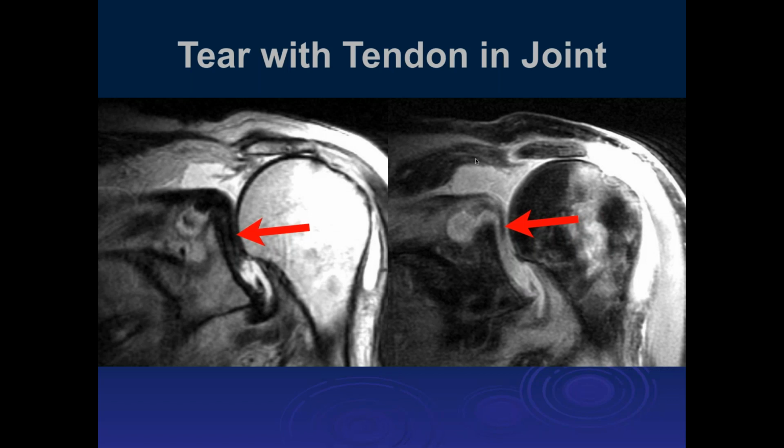And this patient also obviously has superior migration. The only thing you can do with this one would be just about a total joint replacement, or in the old days we used to do fusions. And then we can see there's superior migration, with direct articulation of the humeral head and the acromion. A rotator cuff repair would not be very successful. No, I wouldn't even attempt it.